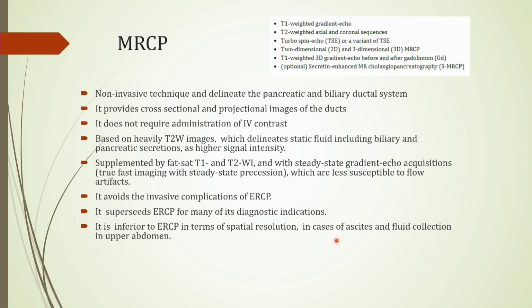MRCP is a non-invasive technique for delineation of the pancreaticobiliary ductal system. It provides cross-sectional and projectional images of the ducts. It does not require administration of IV contrast. It is based on heavily T2-weighted images which delineate static fluid, including biliary and pancreatic secretions, and is usually supplemented by fat-saturated T1 and T2 weighted images with steady-state gradient acquisition. These sequences are very less susceptible to flow artifacts.